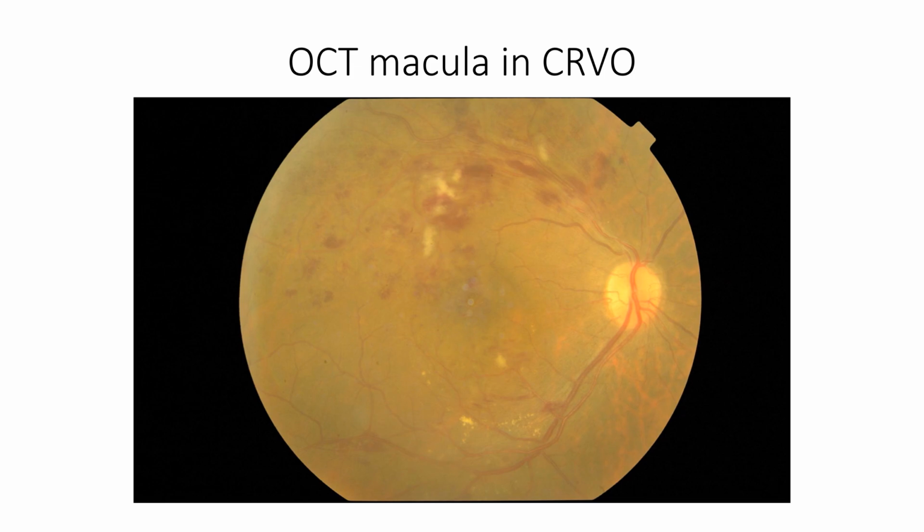Nevertheless, it has affected both portions of the circulation, the upper half and the lower half. In these cases, again, because there's hampering of the venous return, the capillaries burst open and you have retinal hemorrhages, which initially would be flame shaped and later on will develop into dot blot hemorrhages.